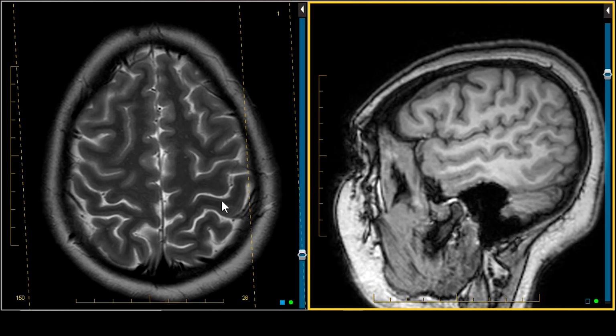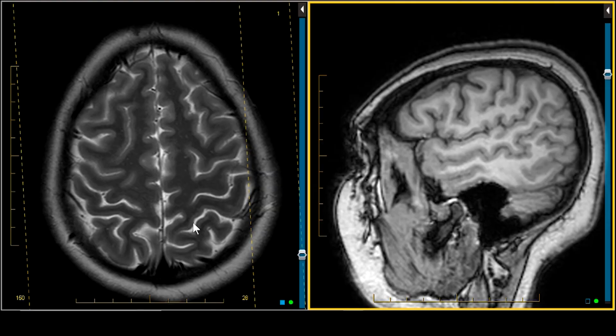Precentral gyrus, postcentral gyrus, postcentral sulcus. Now that you have the postcentral sulcus, you know that it's the upswing of the intraparietal sulcus, so that must be the intraparietal sulcus. Therefore, that has to be the superior parietal lobule, that has to be the inferior parietal lobule, and you're home. Let's talk about the gyral and sulcal anatomy in the midline sagittal projection.